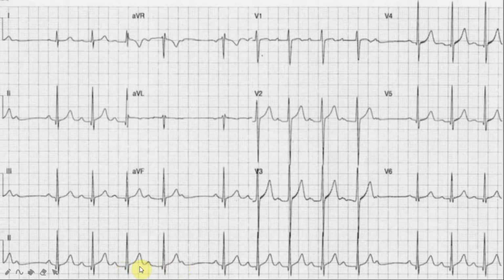Now, to compile all this information together, I am of the impression that the patient has a Mobitz type 1 second-degree AV block. I am a little concerned about this patient. My immediate action would be to seek and treat the underlying cause. For example, the patient may need further workup from a myocardial ischemia point of view. However, in a fit and healthy athletic person, this may be a completely normal finding with a very good prognosis.